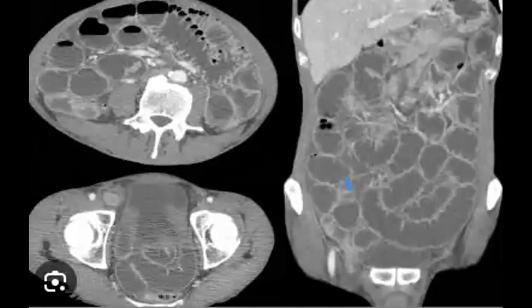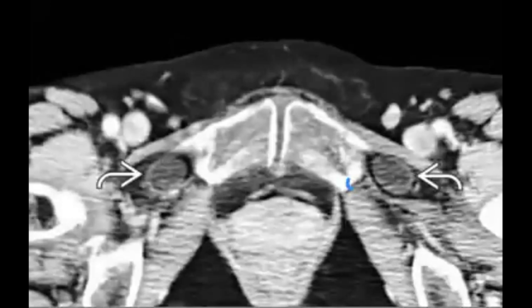So in this patient, you have one type of hernia. If you agree with me, you can see the hernial orifice here, and what it could be, either inguinal or what is called obturator. So we are talking about inguinal or femoral or obturator hernia, such as this one. And usually they give you a history that this patient is an old lady who maybe has COPD, or maybe she's pregnant, or she has a chronic cough.